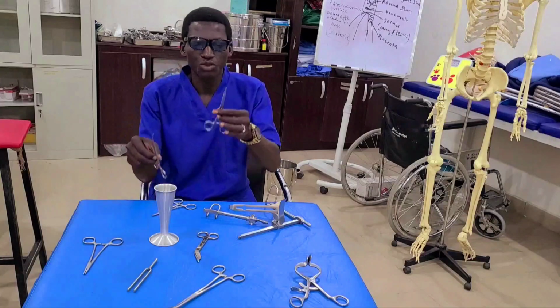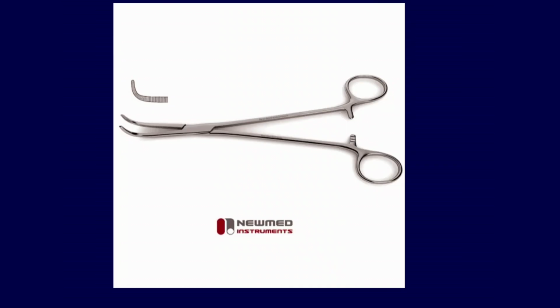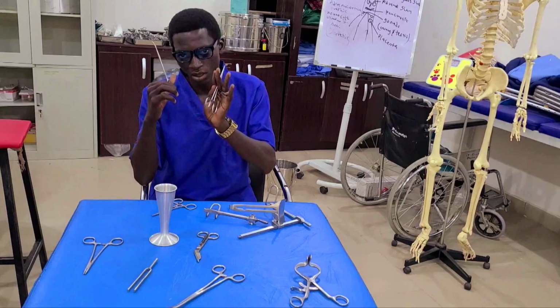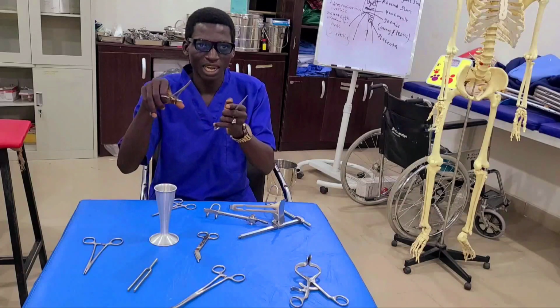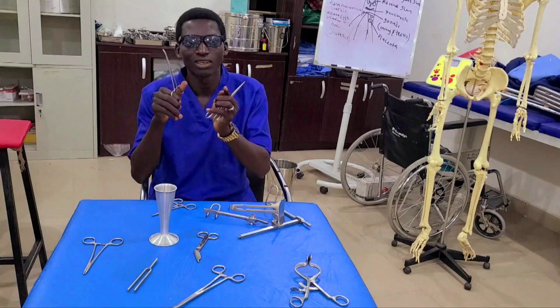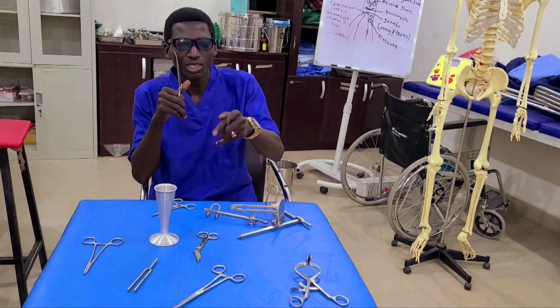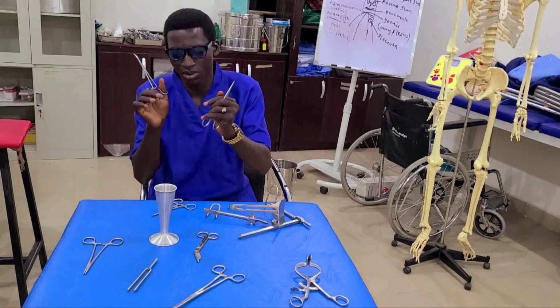Here we have the straight artery forceps. Here we have the curved artery forceps. They are all used for the same purpose. The curved artery forceps is used to clamp the arteries, especially the arteries in hollow organs, organs that are inward, which the straight artery forceps cannot access. Here you make use of the curved artery forceps.